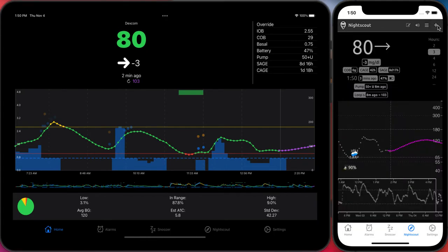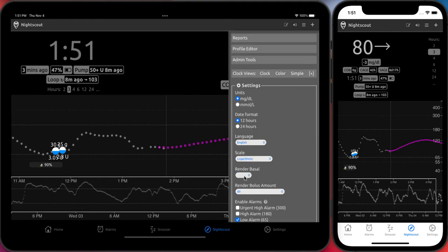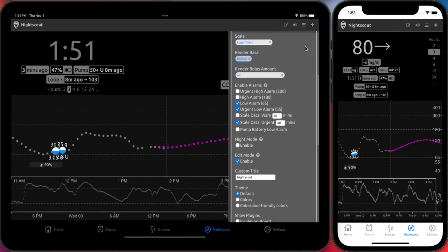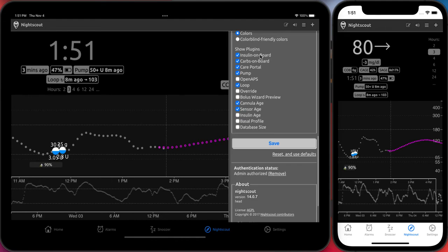So that is the Nightscout tab. The last thing I'll mention with this, if you're wondering why every time you open Nightscout, it's always just gray dots without all the info, and you're regularly coming in here, picking all of your defaults and all of your plugins, you can go into your Heroku variables and you can use the option show plugins to add all the plugins. Usually it's just about everything from your enable line needs copied over there. That'll set those by default.